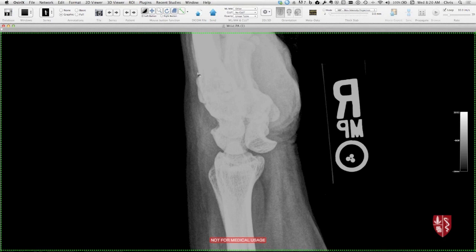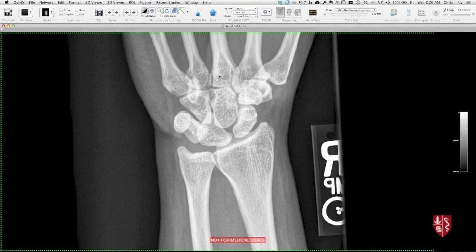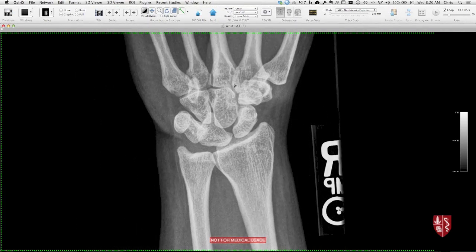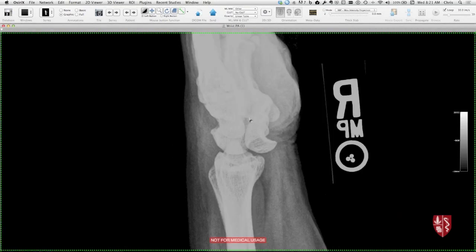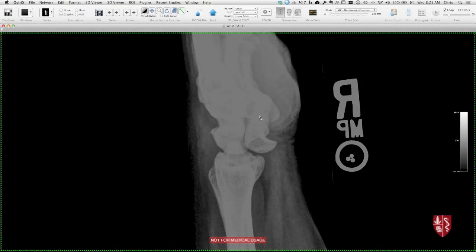This one doesn't window level very well, but if you look at this carpal alignment pattern, it's clearly pretty abnormal. You have a pretty good PA view of the scaphoid, lunate, triquetrum, and pisiform, and this lunate is triangular in its projection here. So that's not normal, and possibly could be a DISI or VISI thing, but it's more extensive than that. If you look at the lateral view here, which again doesn't window level too well, what do you see?